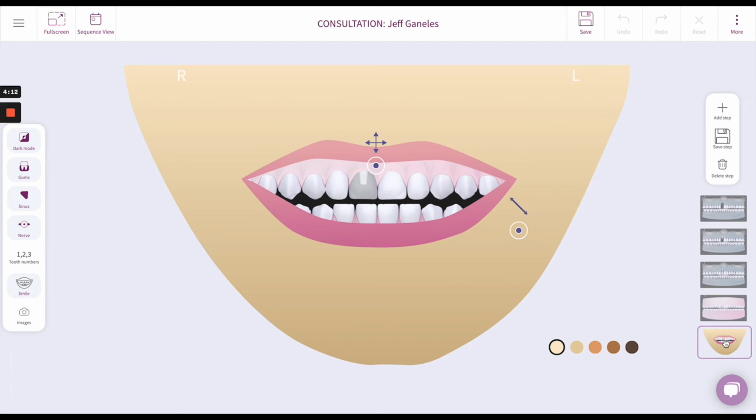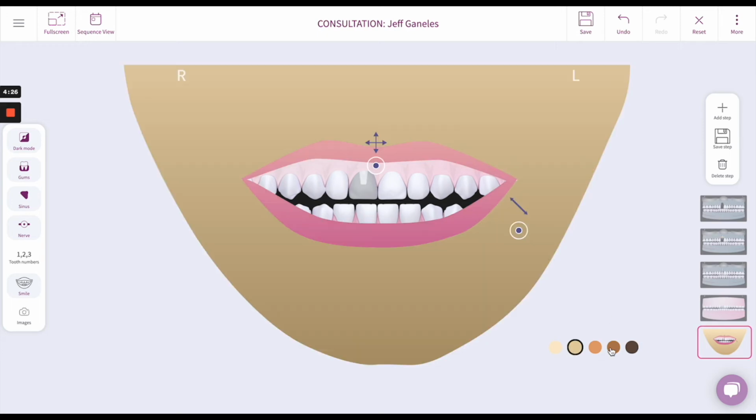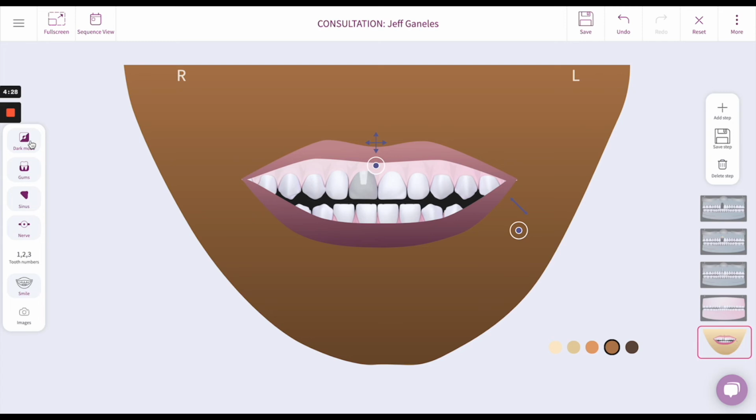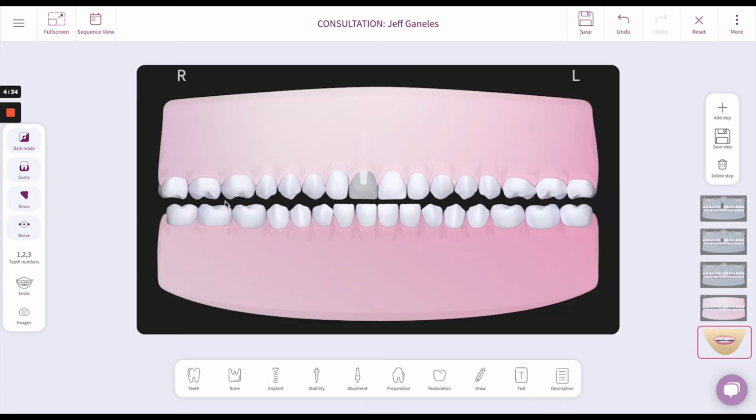So this is just an example of the kind of flexibility that's built in. And some of the other features, we've made this applicable to patients all over the world of all races. So we can deal with patients with darker complexions or patients that have all sorts of other differences from that standard one that we have here.